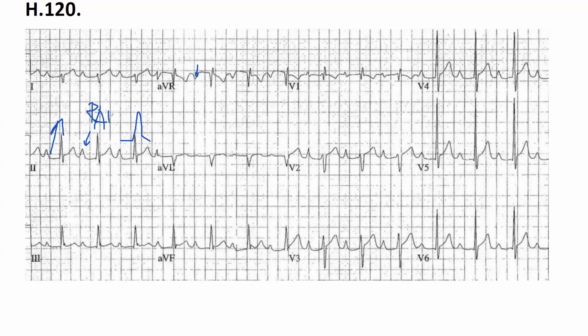Okay, good, so we found right atrial hypertrophy so far. And the PR interval, I think it's a bit longer, a little bit, not too much. Yes, it's enlarged.